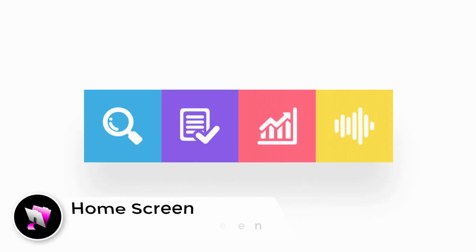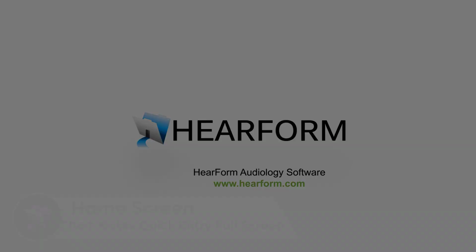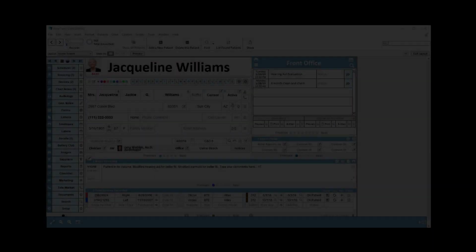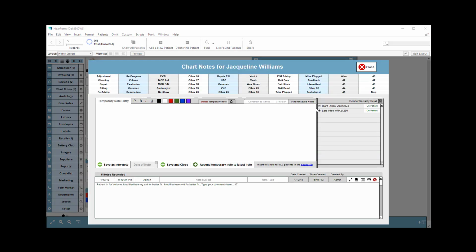Welcome back. This video explains how to use the Chart Notes Quick Entry full screen. It's easy to enter chart notes with HearForm Pro. Simply click the Chart Notes tab up here, and then click the desired hearing instrument on the far right.